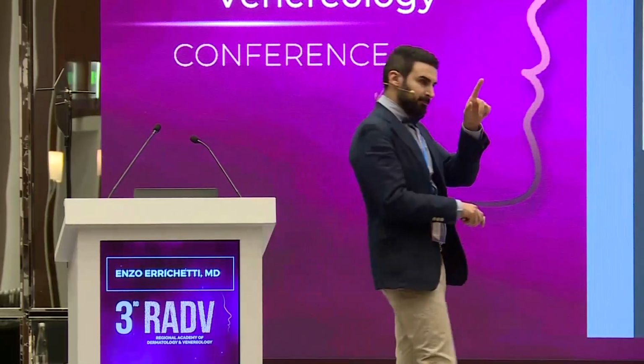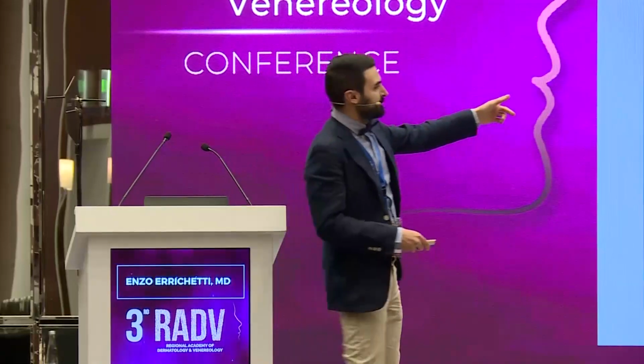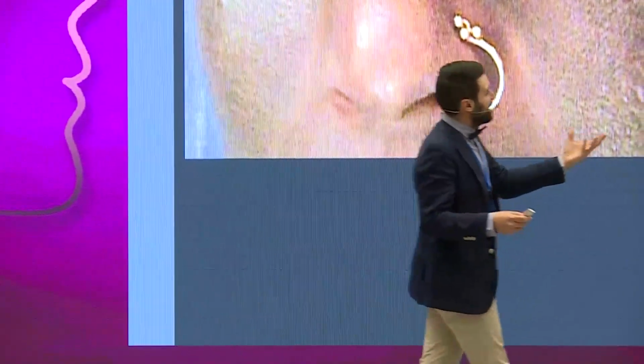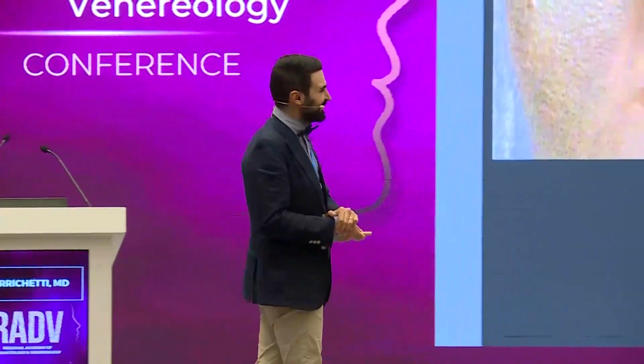Okay, so you told me that this is exogenous ochronosis and that one melasma. Let's see. Do we see ochronosis? Do we see any circles and semicircles? I don't see any. We have dots, which are very dense, but these are dots. Perifollicular distribution. The color is blue, blue-black. So, ashy dermatosis. I think so. Let's see. Ashy dermatosis. Good, good.